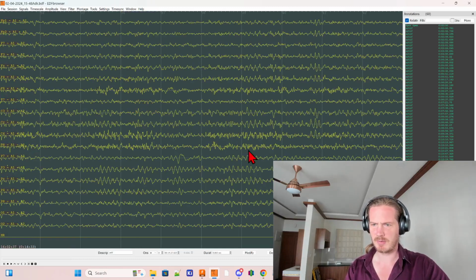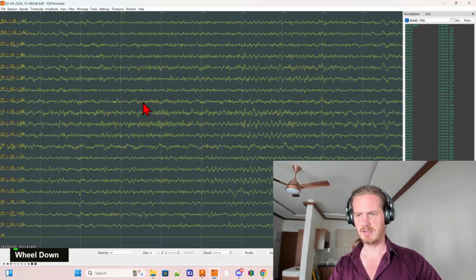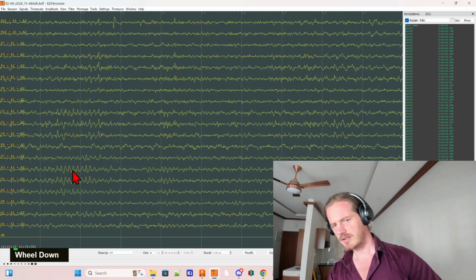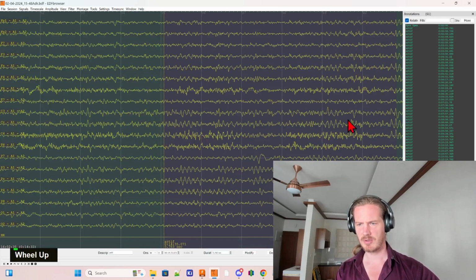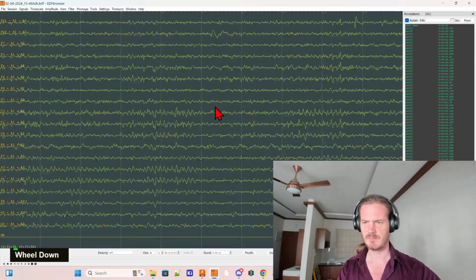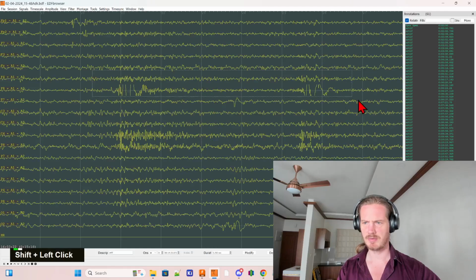But here you see in the back of the head we're having some fast frequencies, and that is typically because of muscle activity. Maybe their neck is a bit stiff or something. Because this is literally the back of the head, this area here. Oh, sorry, this is the back of the head, and this is the middle of the head. So this is most likely some jaw movement. If it were here in the back of the head, it would be stiff neck. Yeah, so here he's definitely moving his jaw.